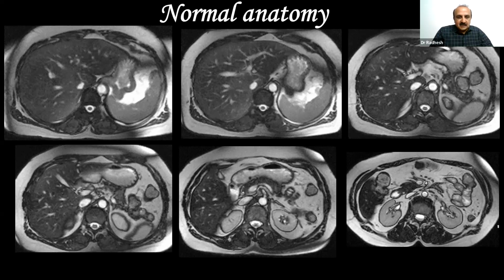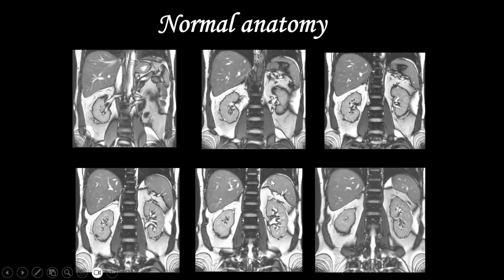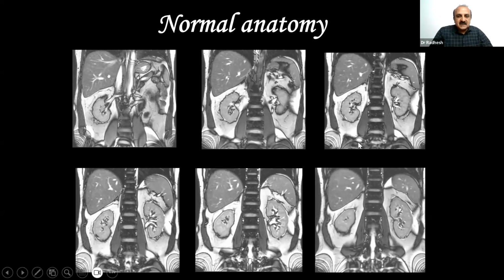Okay. Now, this is a coronal section. Okay, and again, what sequence is this?